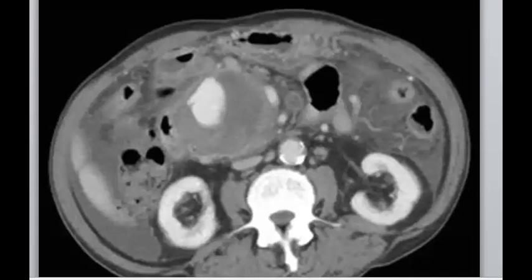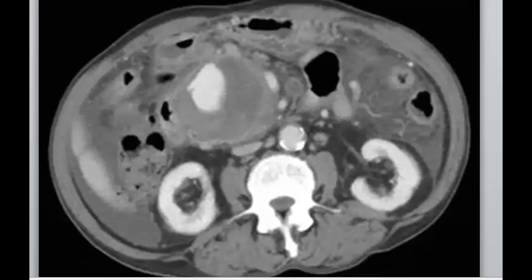And then think about pancreatitis, and when you see this appearance, you can think about pseudocyst. So we mentioned before, pseudocyst can make pseudoaneurysm, and in this case there was rupture. Here there is no rupture, but maybe. And the intervention can help this patient if he has coiling, right?